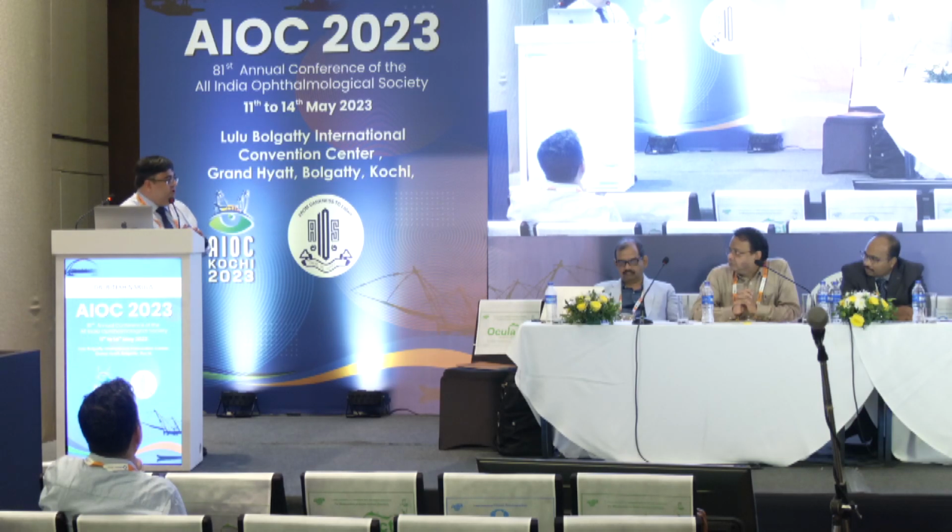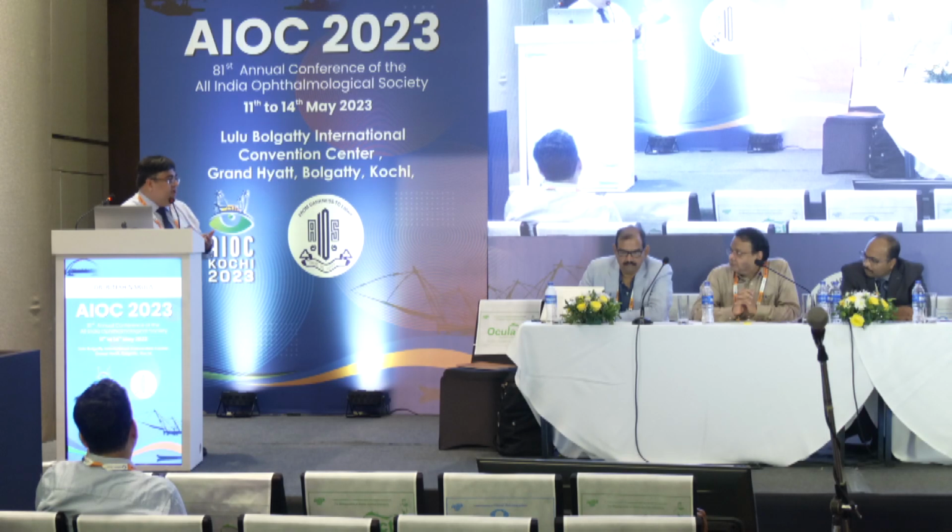It's a real workhorse. Honestly, it has very low breakdown. It is very useful in terms of getting a fundus photo along with the Topcon OCT angio. And so that's my preferred choice when I'm looking at CNV networks. Though Cirrus also gives you a nice CNV network, compared to Cirrus, the Topcon just gives you that extra when you're talking in terms of depth and choroidal networks.